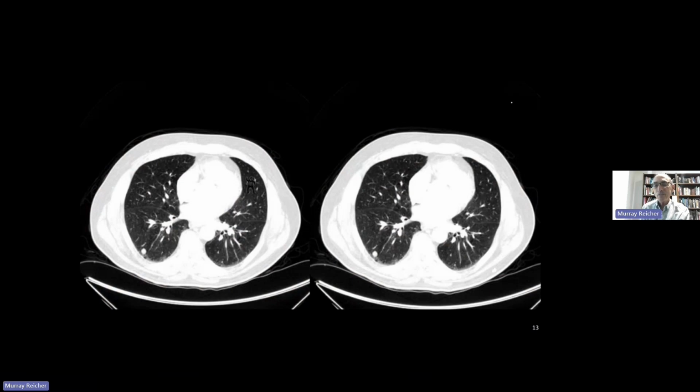Same thing here. I'm looking at two CT images side by side, and you may focus on a nodule here perhaps and say, is this patient better or worse? Well, is the nodule bigger or smaller? Has it changed in density? Has it moved in position? Is it becoming cystic? Those types of decisions require radiologists to start making measurements.